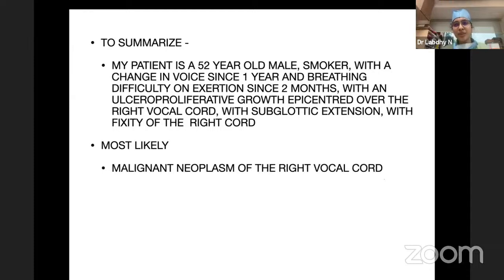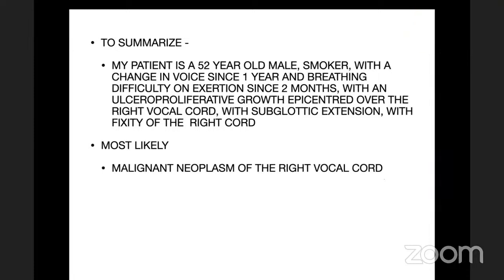But when the postcricoid surface is involved, or the posterior pharyngeal wall or prevertebral fascia is involved, this sign can be lost. So it is suggestive of either advanced disease or postcricoid disease. It used to be a valuable sign before the era of CT and MR, but now it has lost its importance. But it does show laryngeal fixity and is a sign of extralaryngeal spread.